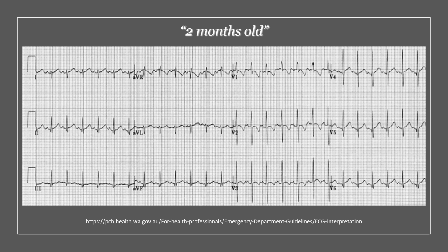So if we go back to the ECG that we've talked about before, not the first patient we talked about, our impression when we thought that this is a 20-year-old female coming with shortness of breath was that we've got right bundle branch block, right axis deviation, sinus tachycardia, and T wave inversions from V1 to V3. These are all signs of acute pulmonary hypertension, so that's a PE.